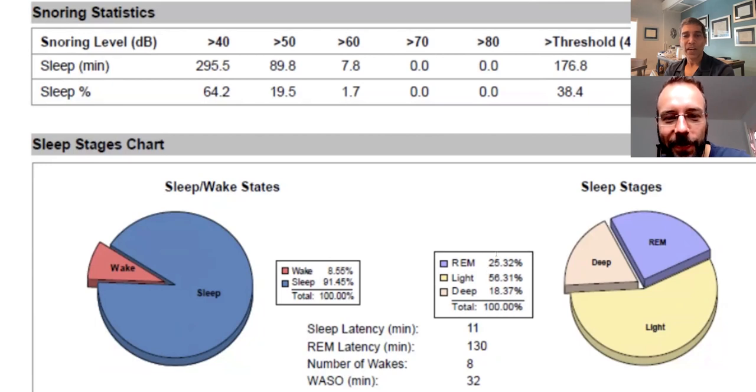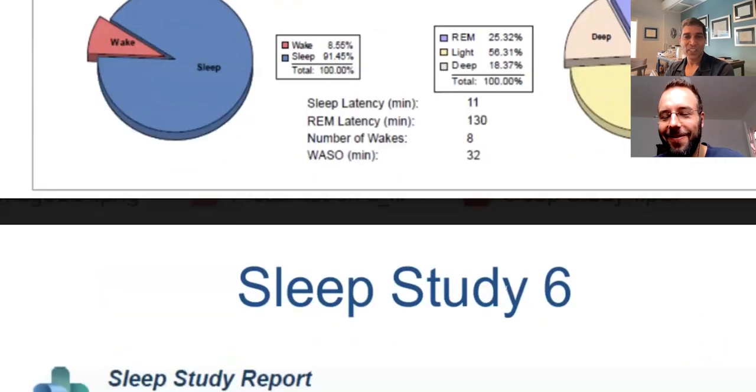Anyway, so the REM sleep is 20 to 25, looks great. Deep sleep 15 to 20 looks fine. So see, like you said, this didn't impact them. You're right. This person might walk in the office and say, oh, I feel fine. I've gotten along this long without it.